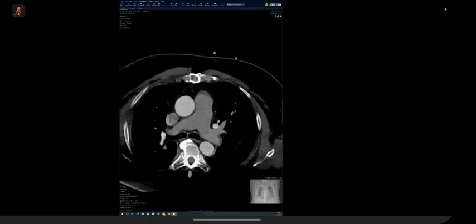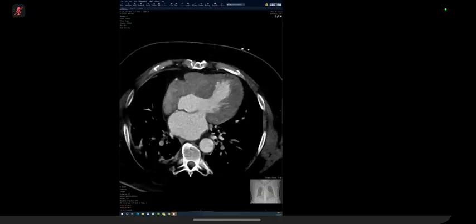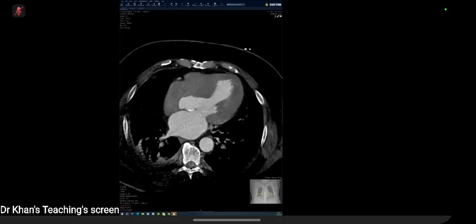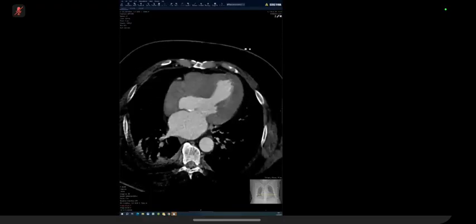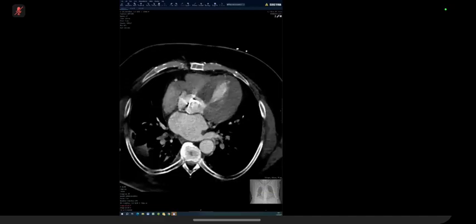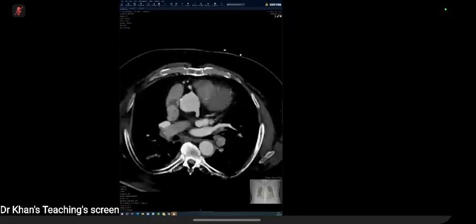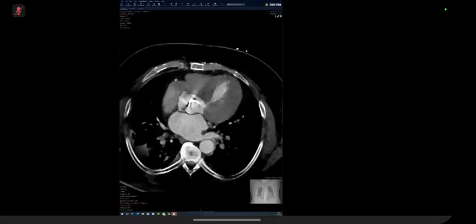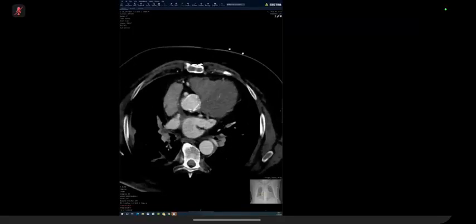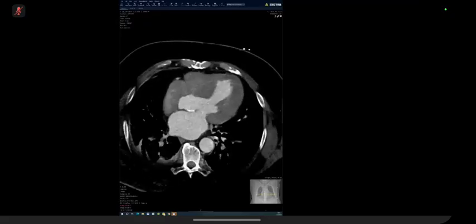So you would describe that. If you pick that, you would say the patient has an aortic valve replacement. There is an irregular appearance to the contour of the aortic sinus. I am suspicious for outpouching. Given the patient's previous history, this may represent, and I want you to think out loud, this may represent normal post-operative appearance. I would be interested in looking at the patient's previous history. Given the patient's symptoms and aortic valve replacement, I would consider asking the cardiologist to do an echo to look at possible aneurysmal dilatation of the aortic sinus.